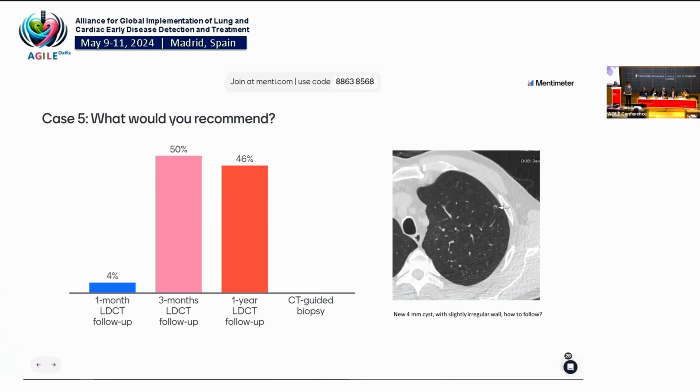And maybe it's not new, maybe you were not able to see the lesion in the past. Okay, but this one was new. It was the same technique before, and you really have to do thin slices, right? Okay. Yes.